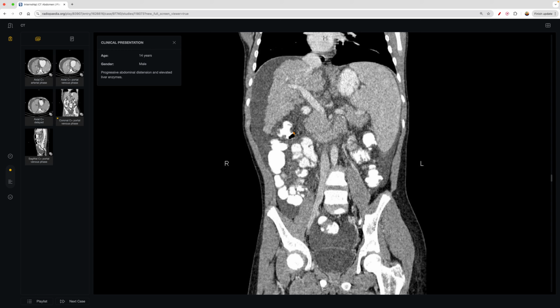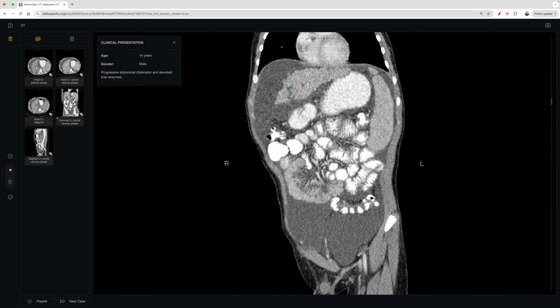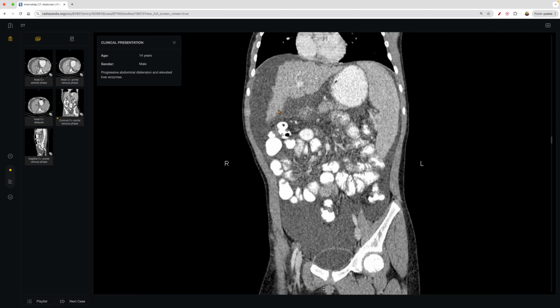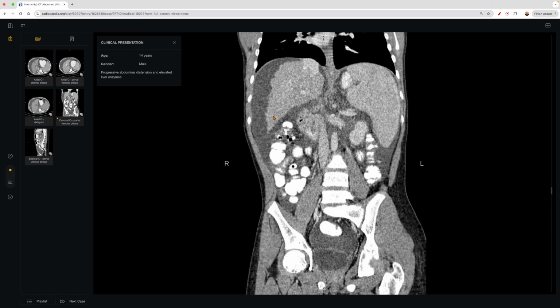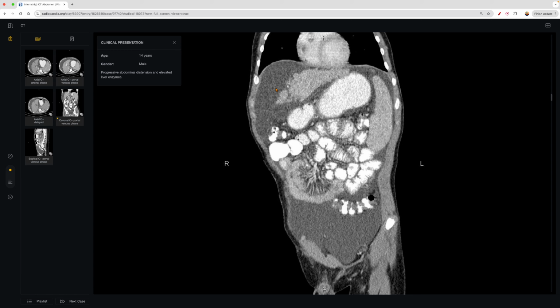So this male here has cirrhosis. And the patient has cirrhosis, and we can tell because you can see the lumpy nature of the liver here, right? It looks atrophied. It's very small. And while you can measure it out and get into more determining objective metrics, you certainly can just tell visually. And then given the patient's clinical history, we also have some fluid accumulation.